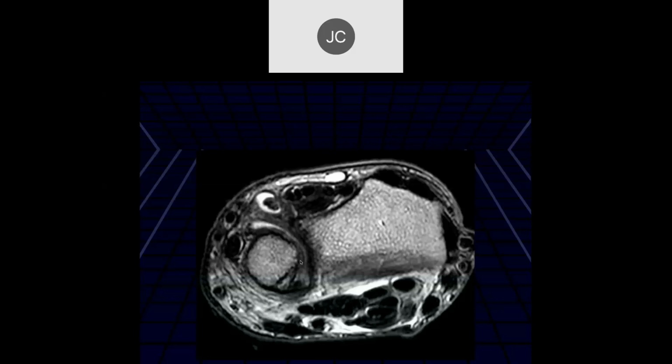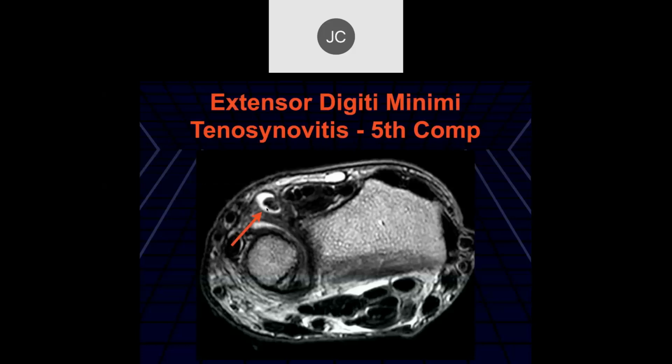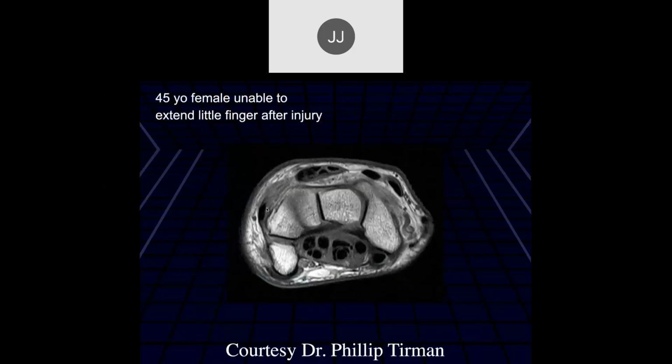A little bit more proximally in the palm of the hand, the extensor tendons are actually interconnected. So it's difficult to extend one tendon markedly without extending all the others because of that. And then here we can see fluid and an abnormal tendon within the fifth extensor compartment. If you look at the anatomy, you see the connection between the tendons. I think I'll show that later.